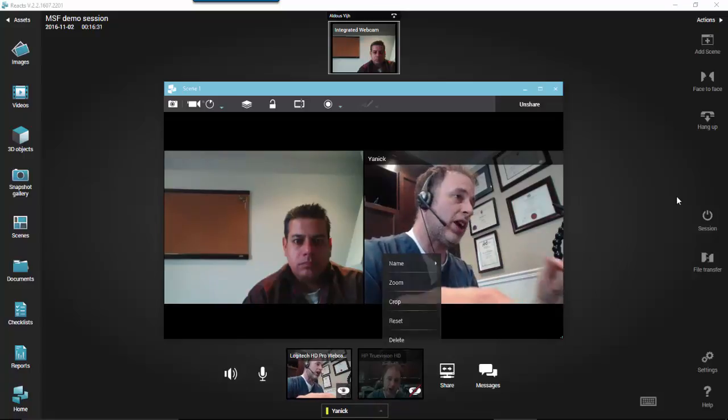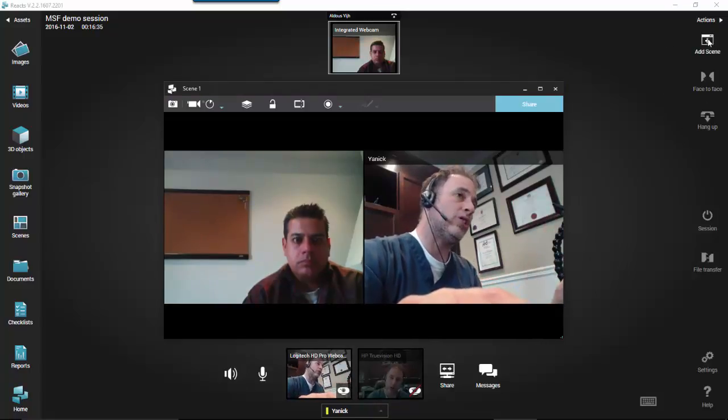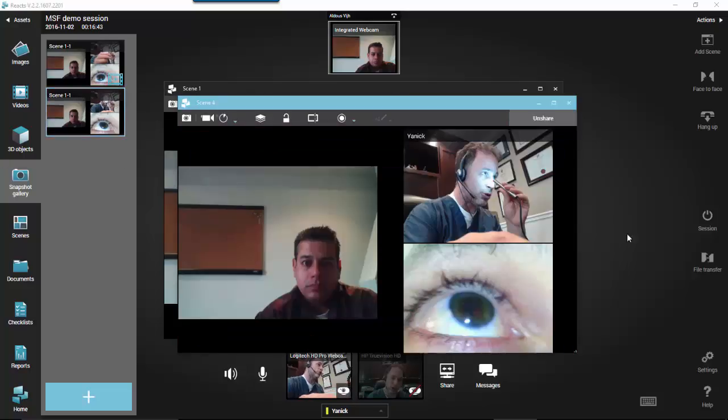I can unshare that scene. I could leave it shared, but just to avoid confusion, add a new scene, go open my snapshot, take the image I took earlier like this, and share it.